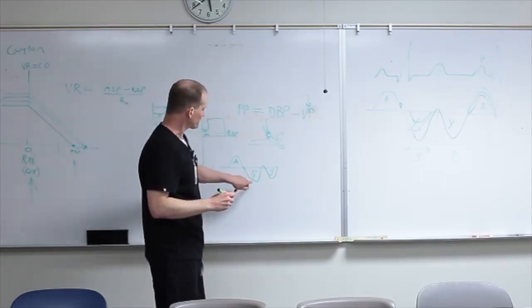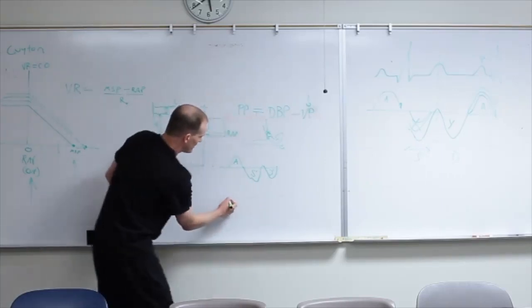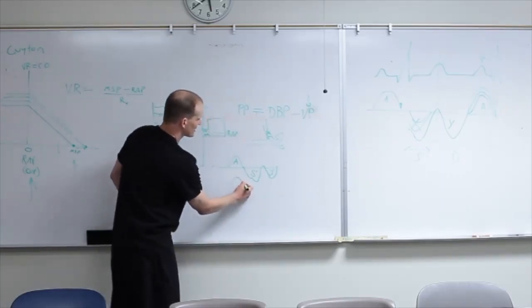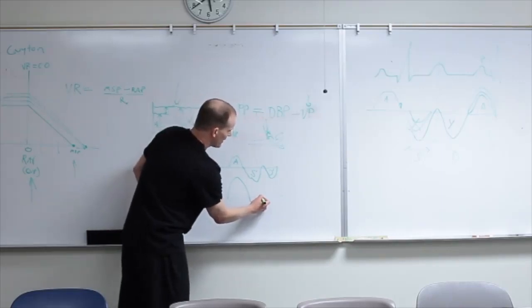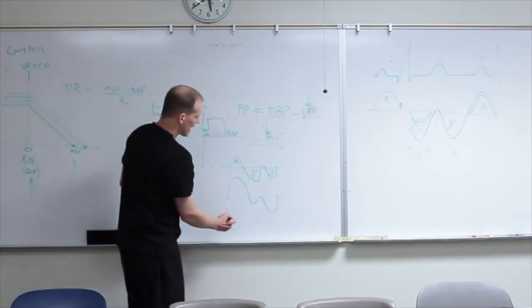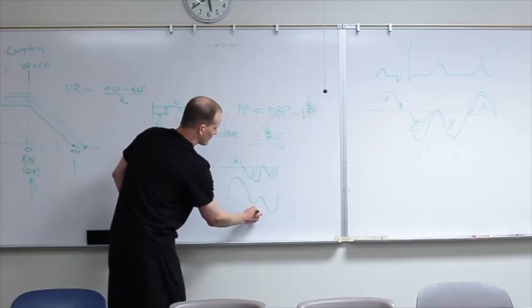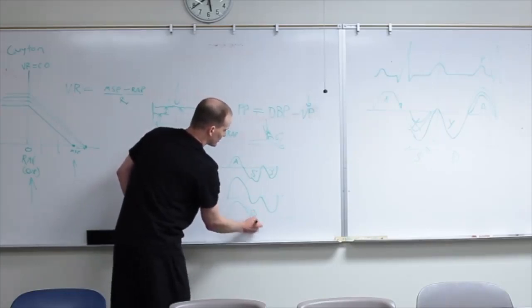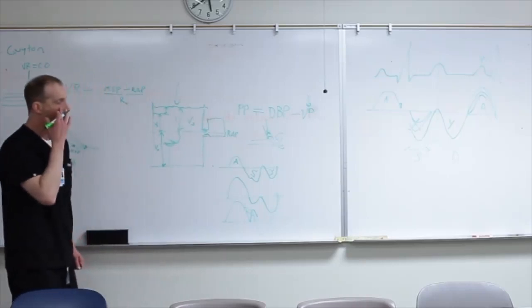Okay, so as the pressures go up, this gets bigger, lasts longer, this gets smaller, and this stays about the same. Okay? And eventually what happens is this actually reverses, kind of blurs here, and we get a kind of biphasic sort of looking thing. Okay?